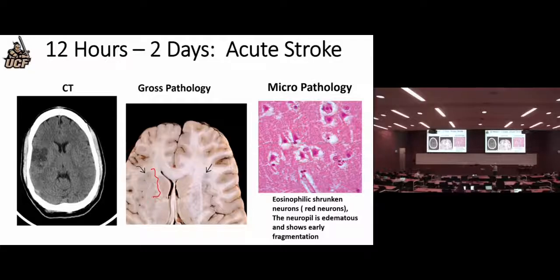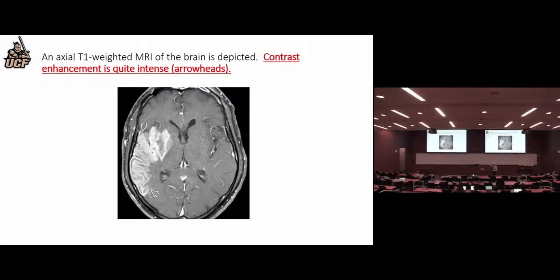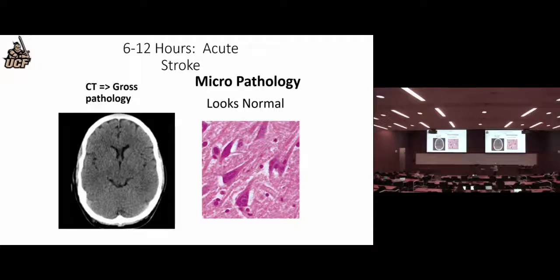And the real thing you can see is not so much that they're red, at least in my opinion of the pathology. Let's go back to, see if I can find his normal one. His normal one, that's red too. But this sort of area around it, which is, I think, partly some surrounding tissue, and you look at the relative size of this white halo, and you look at the shape, and it's sort of like a nice shape with this tail on it.